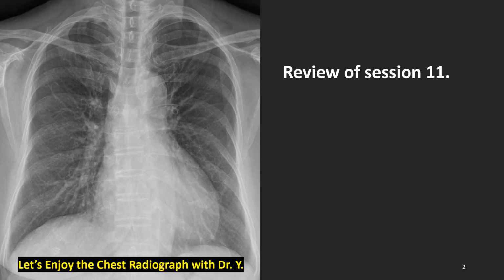Before starting atelectasis, let's review session 11, pulmonary hilum. We remember this woman's chest radiograph. She used to be healthy last year. Please look slowly and carefully at her healthy, normal-looking right hilum.